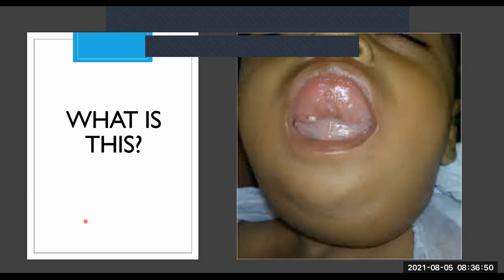Right. So even if you don't know what the diagnosis is, are you worried? Why are you worried? Very good. The airway is compromised in this patient. All right. Where does the problem seem to be coming from? Is it the tongue or is it below the tongue? Below the tongue. Very good. Because if you look at the actual tongue, the tongue looks fine.